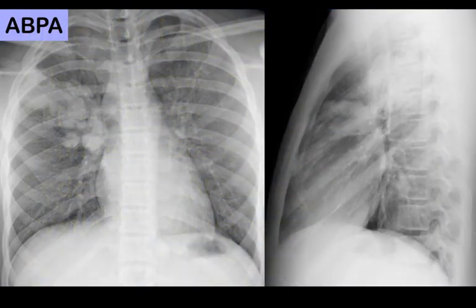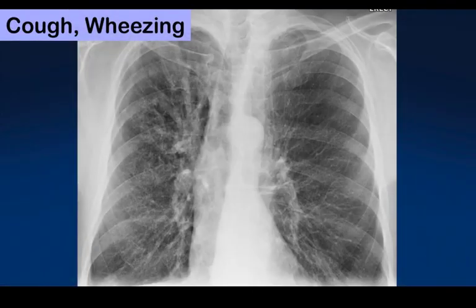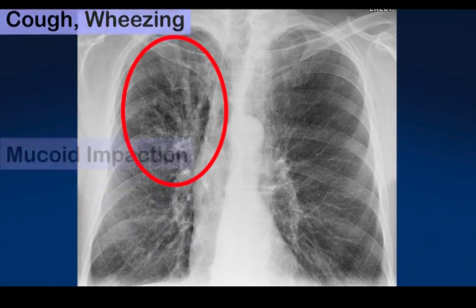This is a patient with allergic bronchopulmonary aspergillosis, where large mucus plugging is one of the hallmarks or radiologic keystones for diagnosis. Patient with cough and wheezing who also has dilated airways and mucus in the right upper lobe. Notice the background of emphysema. This was an older patient who was a smoker.